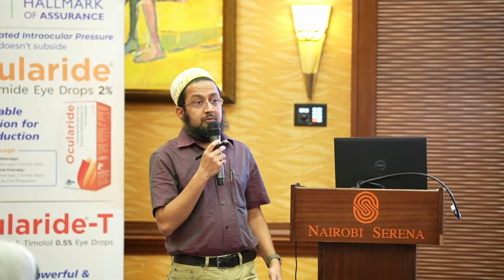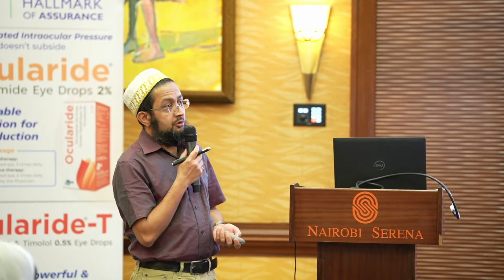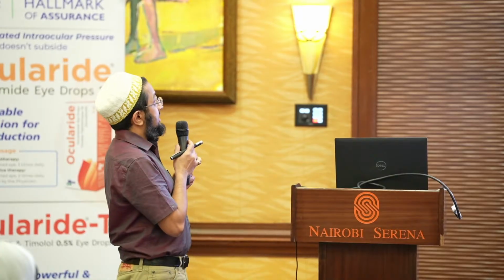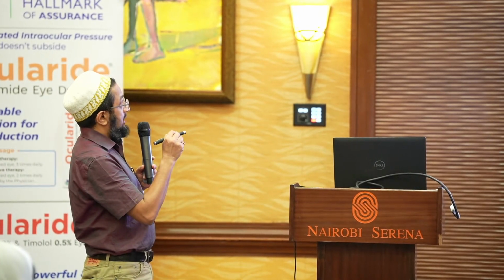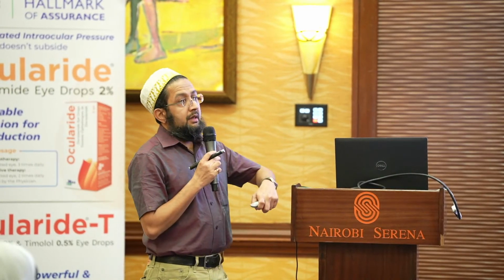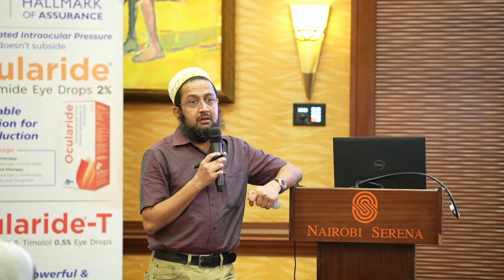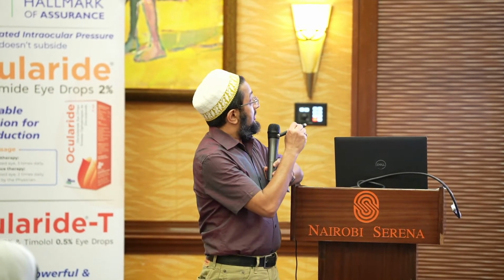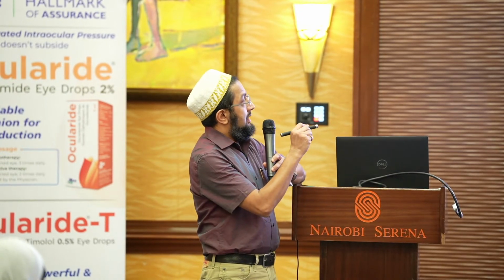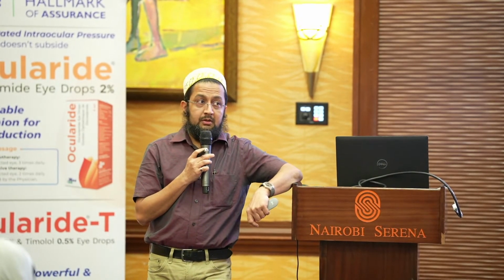Now, viral retinal necrosis. This is acute retinal necrosis due to herpes simplex. You can actually see the necrosis happening here in this area. Okay? Most important thing in these patients, avoid steroids and start them on antiviral therapy. The sooner the better. The longer you take, the more the virus is going to eat up the retina. And this is how the retina looks after it has healed. And these patients do require very close follow-up, okay?